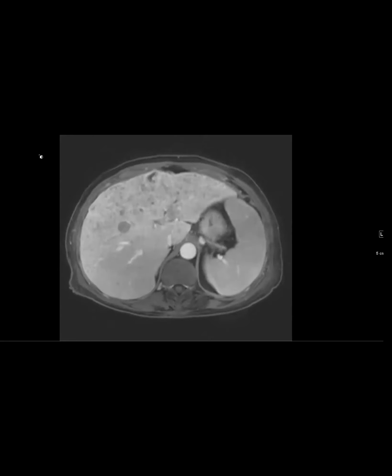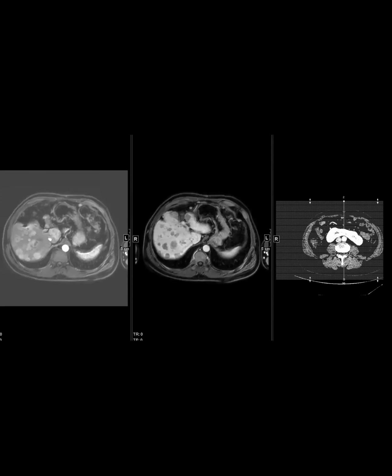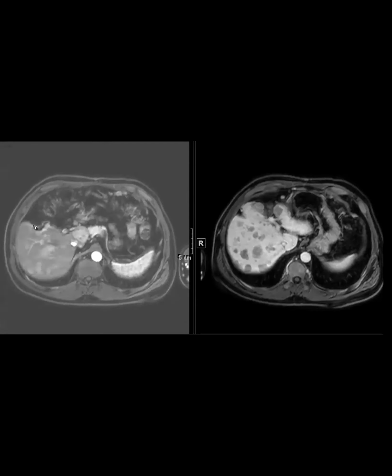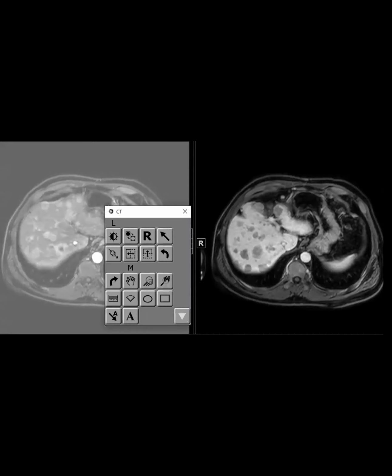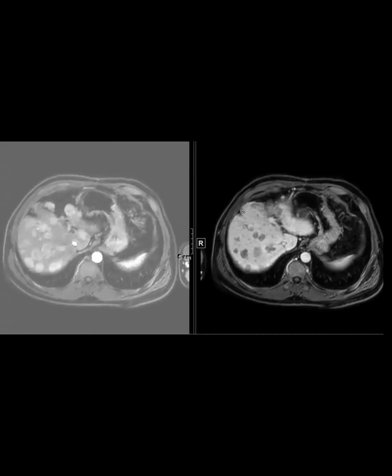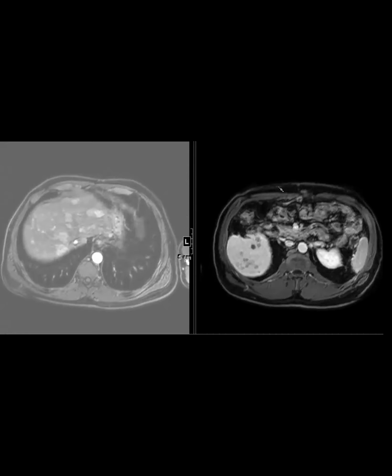Another quick liver case. This is just a quick point. This patient had a personal history of HCC, had it resected. You can see the stuff here. And about a year later, comes back with just these innumerable masses, all with arterial phase hyperenhancement, all with washout appearances. So these are fairly classic HCCs.